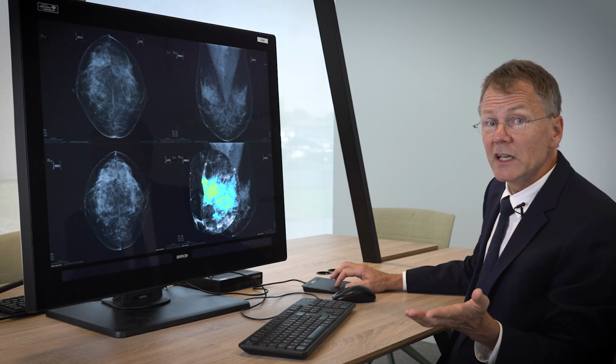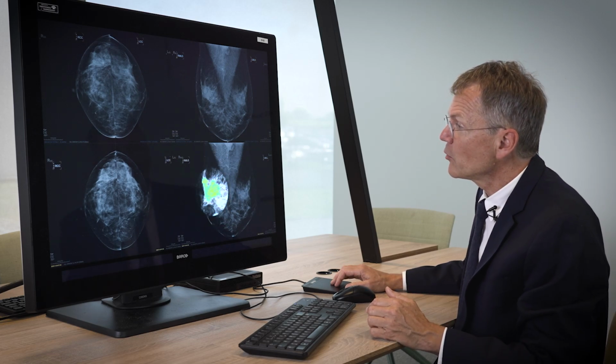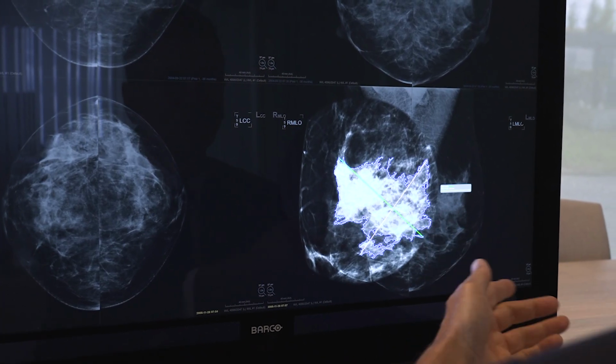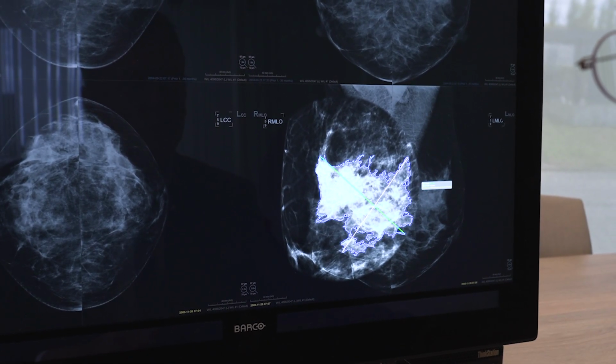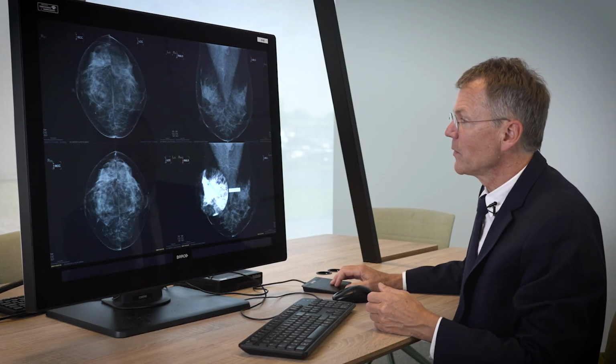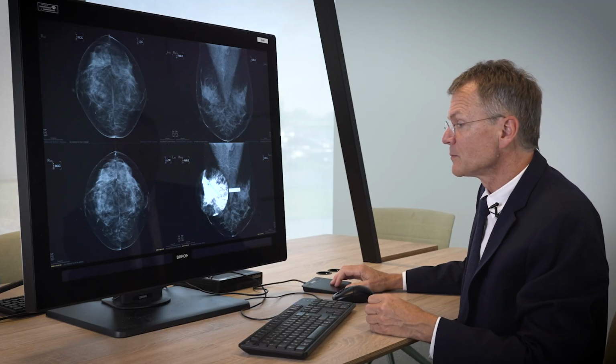Now, in some cases, you'd be done at this point. In another case, I might say, oh, I'm going to measure this. And now I get the measurement of that outline, and then I can report the major and minor length. And it's very repeatable how that works.